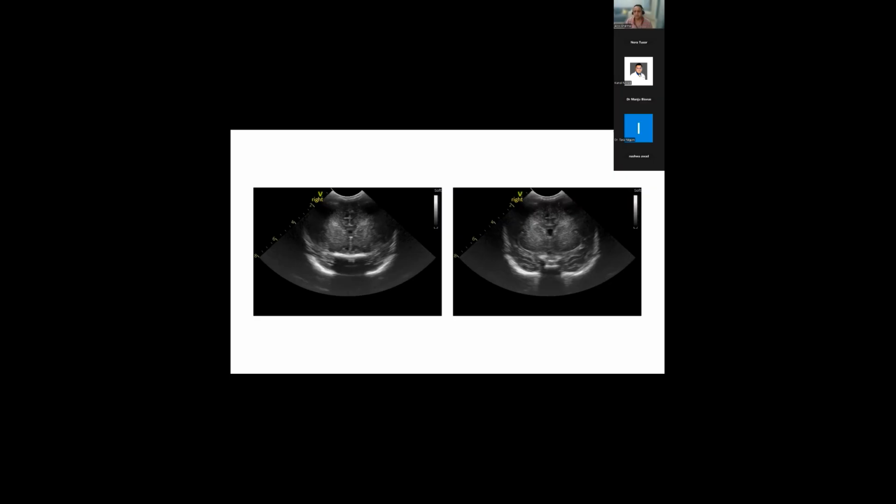We can see the interhemispheric fissure in the middle, in the midline on the top part. Yep. So, you can see the interhemispheric fissure. You can see the cavum septum pellucidum. You can see the orbital ridges, frontal bone. Then corpus callosum in between the two.